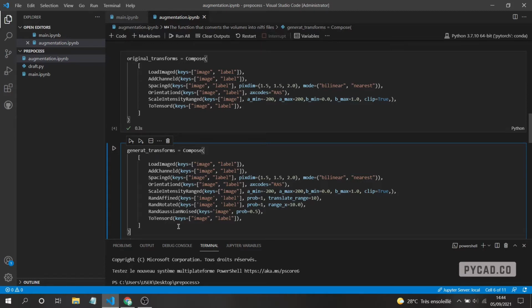So the first thing that I am saying here, because when we do the pre-process, when we do the augmentation to the data, we need to save them. So in my case, I used two ways. The first one is applying the transforms, which are this one. I will go through them step by step, but now I am talking only about the ways how to apply these transforms. So the first one is to apply them during the training.